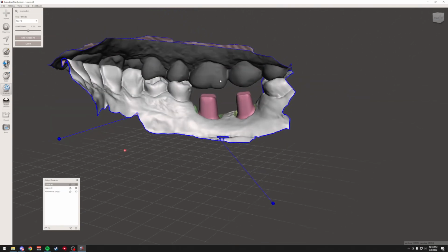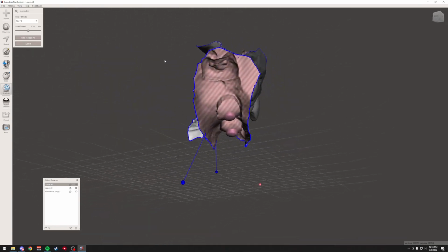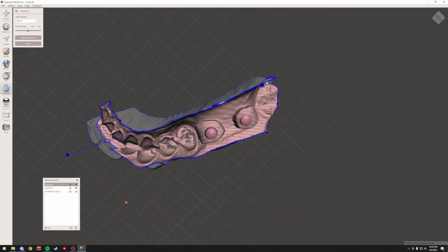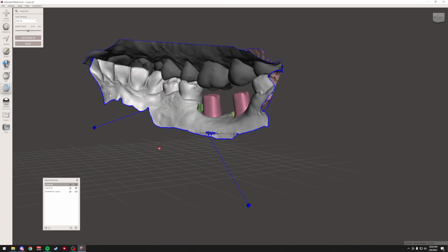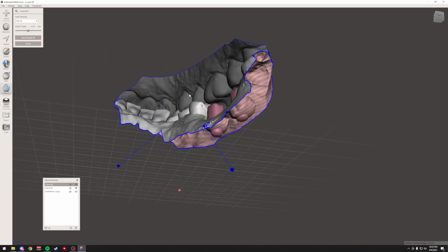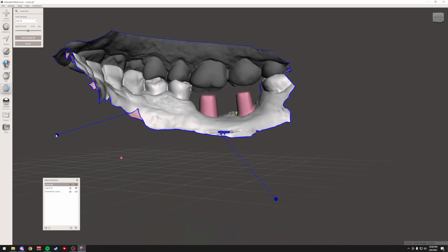And that's a problem because if you click that, you're going to be sitting around for a while or you're going to lose all the work you just did. There's really no way that this is going to accurately fill in the bottom of this because it doesn't have a smooth enough surface. We have a lot of irregularities, and so it's going to spend a lot of time thinking about that. It's probably going to fail or crash, so stay away from that one.